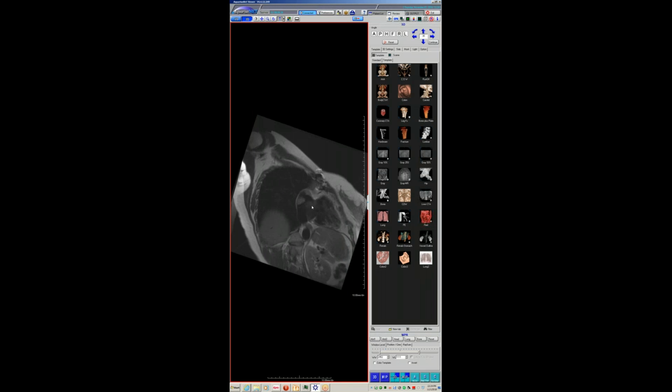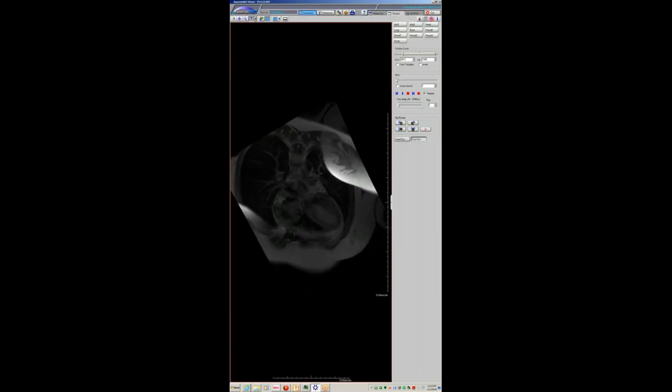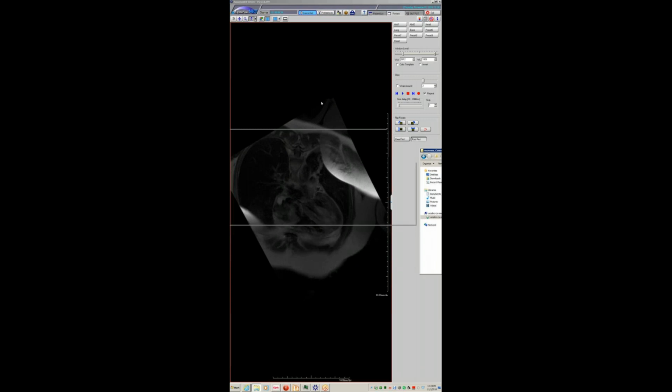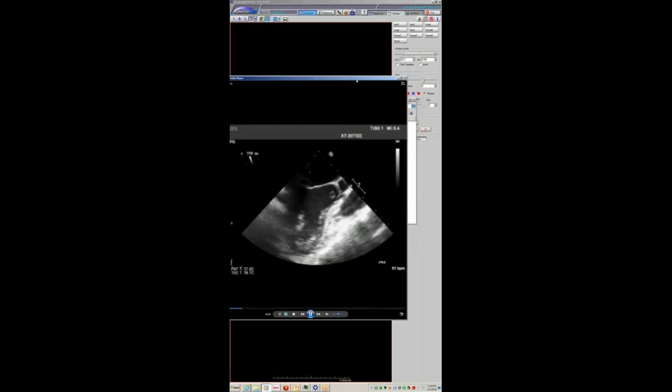So she has these multiple myxomas, and I have MRI showing all the different imaging of the myxomas: heavily T2 weighted images, less heavily weighted T2 images, T1 post images. We can see it enhancing. But here is nicely the TEE, which shows that she's had like 4 or 5 resections for myxoma. And in the last one you can see one dangling in the LVOT. So we know most myxomas do not occur in the LVOT, and that most myxomas occur in the left atrium along the interatrial septum. Right atrial myxomas can be a little more variable.